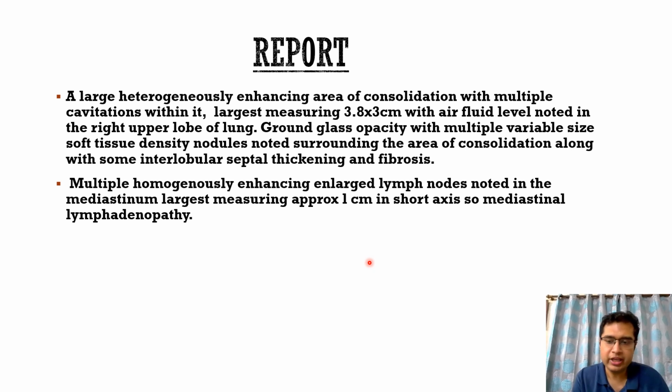So in a patient who has already completed her course of ATT and now has come for a follow-up after 1 year, what do you think we should give in the differentials for this particular picture? It's basically a cavitating consolidation. A cavitating consolidation which is there for 1 year and is not resolving with ATT, we can think of drug resistant tuberculosis, and what else comes to your mind? Fungal infection definitely should be considered as a possibility.